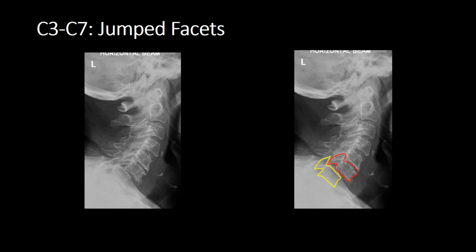Now we've got alignment. So we come down our anterior vertebral line. Whoa, look at that, there is a big old step there. We have an abnormal anterior longitudinal line. Let's come down our posterior longitudinal line. Oh, that's disrupted, the posterior longitudinal line is disrupted. This is abnormal. Let's look at our spinolaminar line. Down we go, down, down, down. Oh, and there is a step, and we can see there is disruption to our spinolaminar line.